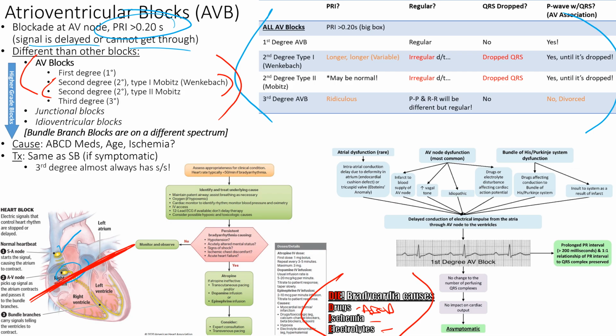Is it Wenckebach or not? It doesn't make any sense. Either way, we'll go over these. And as we mentioned on the title slide, we had which ones are regular, our first degree and third degree.